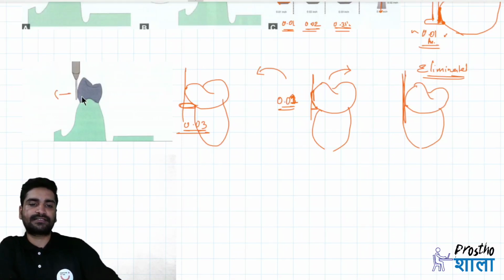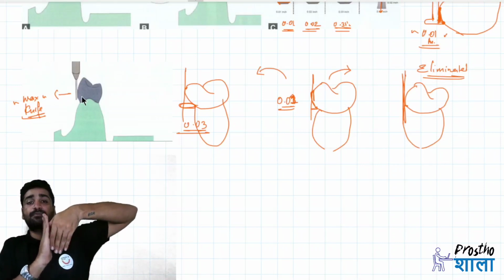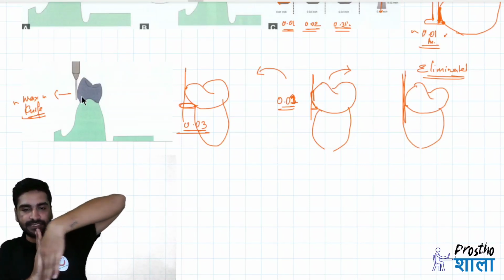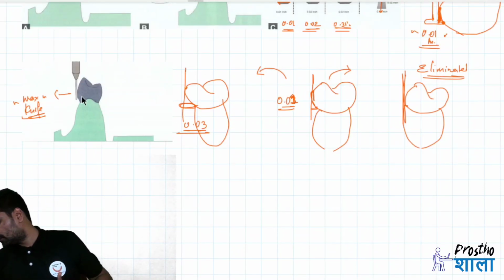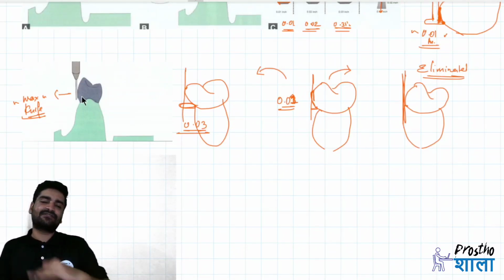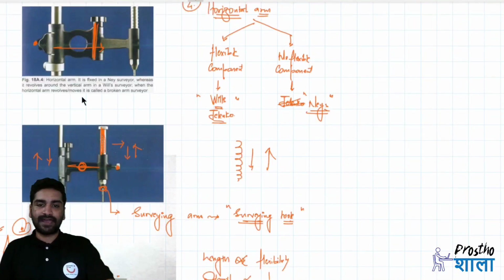You have a wax knife. Okay, so you have a wax knife. So now when we talk about wax knife, it has a sharp bladed surface on one side, which will help you to contour the surfaces of the wax. Any excess wax or any area which has to be modified or recontoured can be done using a wax knife.